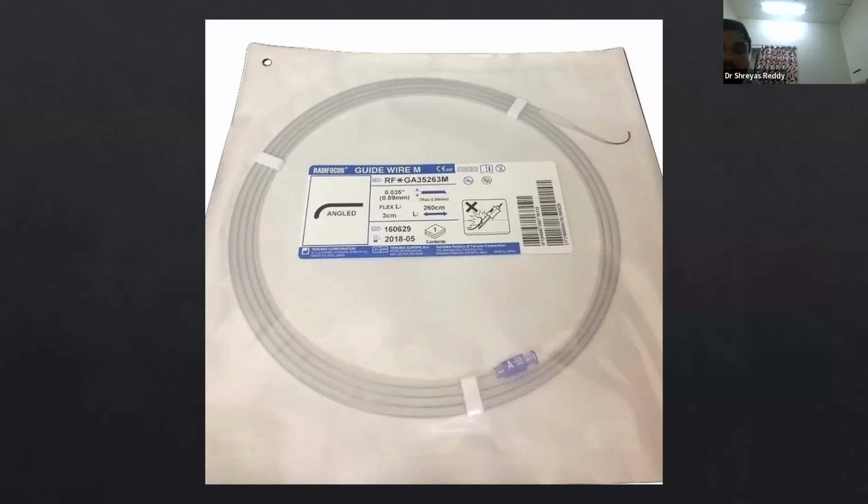Yeah, so it's hydrophilic. Why do you need hydrophilicity when you get inside the blood vessels? Easy passage of the guide wire. Smooth passage. So it gets activated. Hydrophilic coating generally slides inside the arteries very smoothly, so that there's no friction between the blood vessels and the endothelium is not damaged. And what is the other type of guide wire you know of?